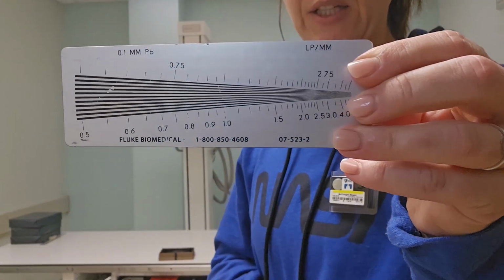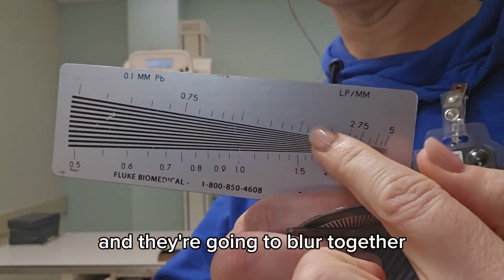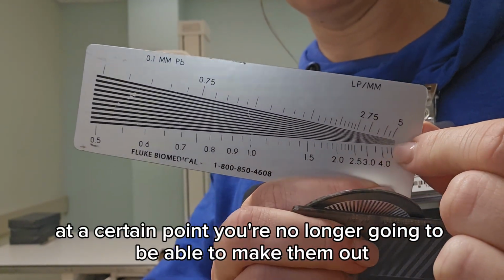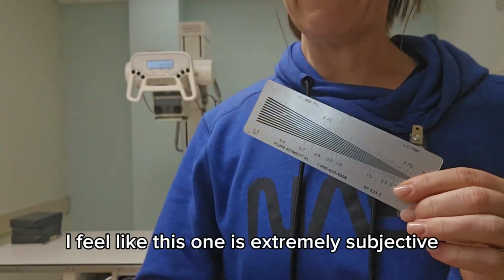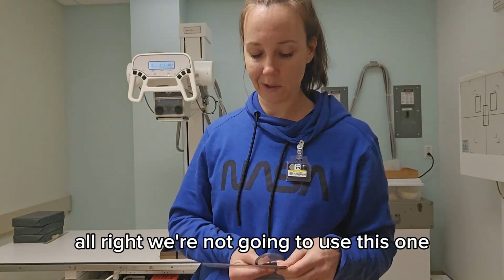This one, you can see that we have a bunch of lines, right? And they're going to blur together at a certain point. You're no longer going to be able to make them out, and then that would be the spatial resolution. I feel like this one is extremely subjective, so I show it to y'all, and then I'm like, all right, we're not going to use this one.